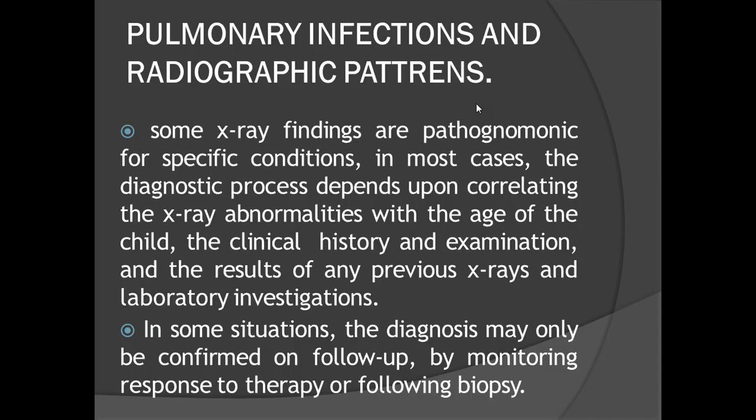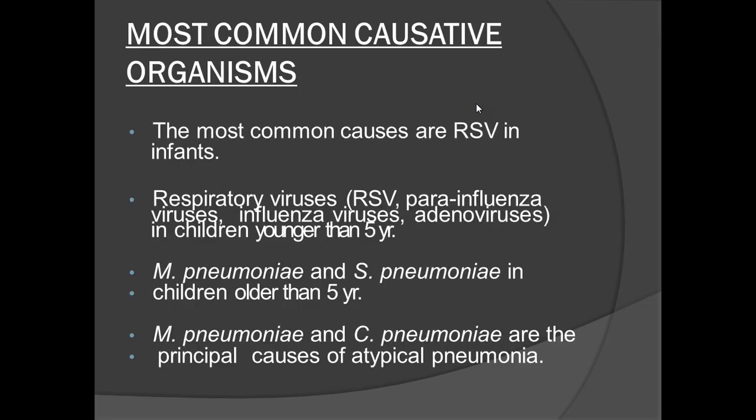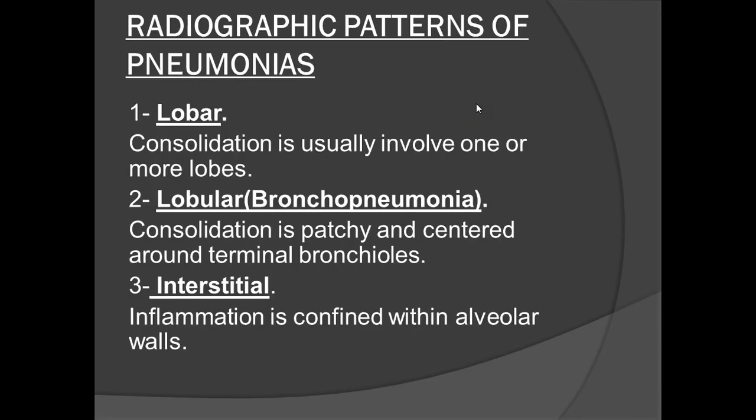Coming to the pulmonary infections, radiographic pattern recognition forms the cornerstone for successful X-ray interpretation. The most common causative organisms are viruses and bacteria: Streptococcus pneumoniae, respiratory syncytial virus, and Mycoplasma pneumoniae in atypical infections. The radiographic patterns are lobar, bronchopneumonia, and interstitial pneumonia.